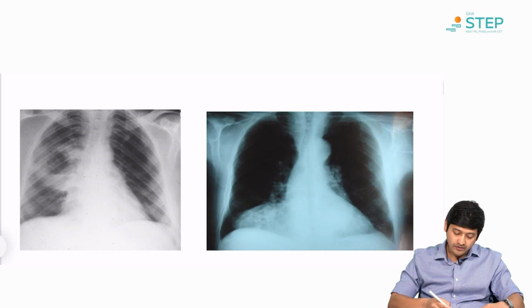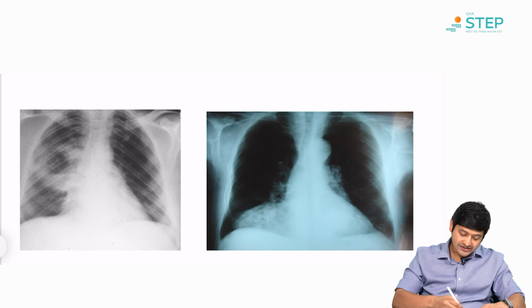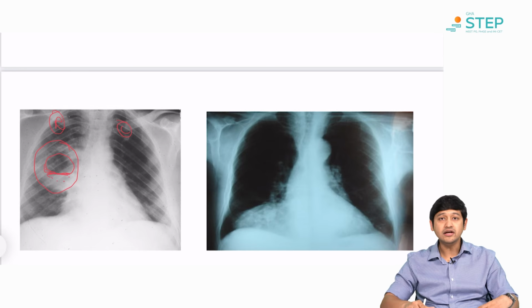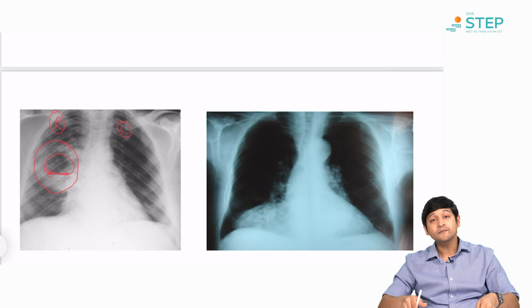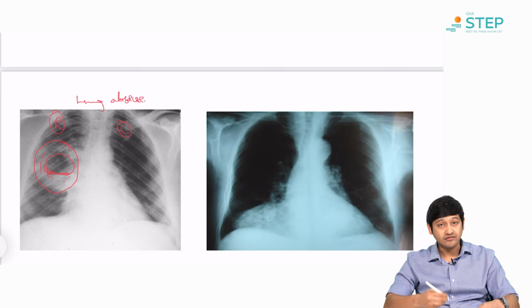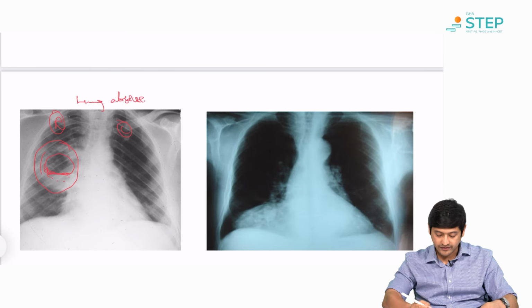We have a plain radiograph of the chest where we see on the right side a thick-walled air-filled cavity which has an air fluid level, probably because of infected material, infected fluid or hemorrhagic content. So this is what we would call a lung abscess. You have a thick, sometimes a shaggy wall, especially when seen on CT, and this patient is going to have some sort of infective history. We did see that in our case, but it did not look like this finding.